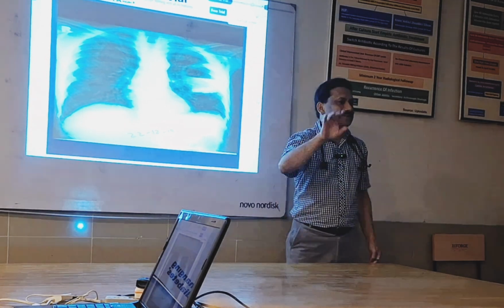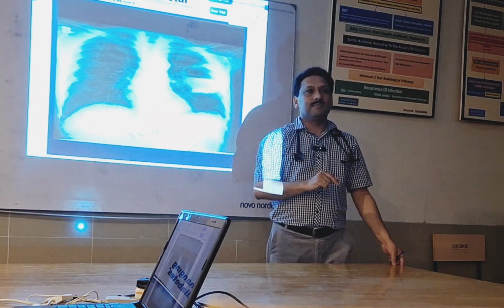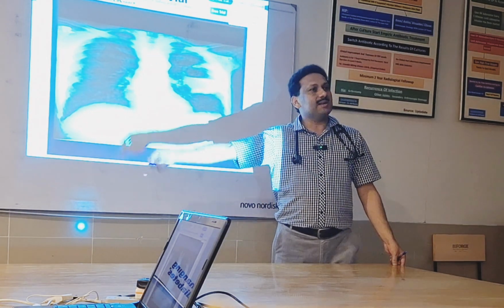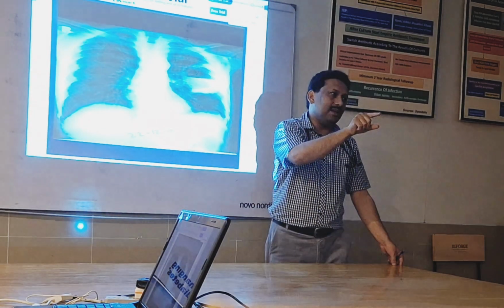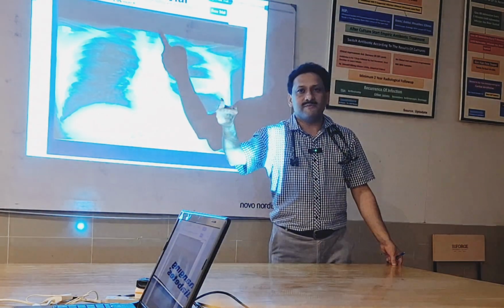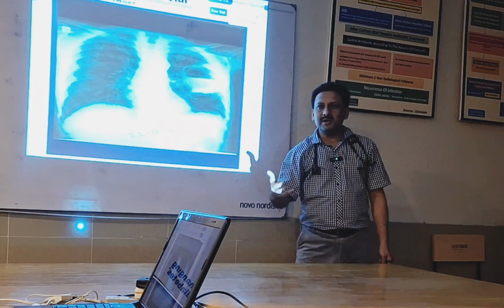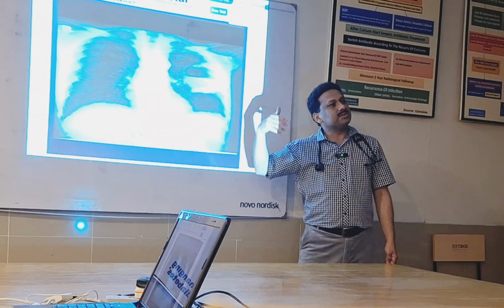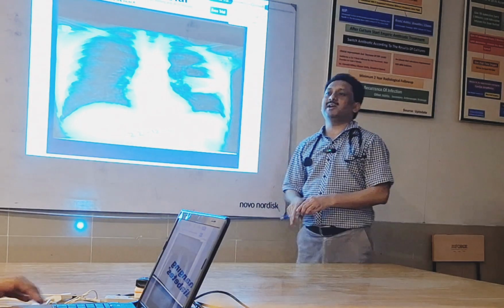So that highly suggests that the cavity is not secondary to malignancy, because a cavity can be secondary to malignancy as well. So the satellite lesions' importance is actually in relation to that particular fact. If somebody ever asks you this question, there is a cavity, what are your differential diagnoses? The differential diagnosis includes, one, malignancy. So that's the importance of the satellite lesions.